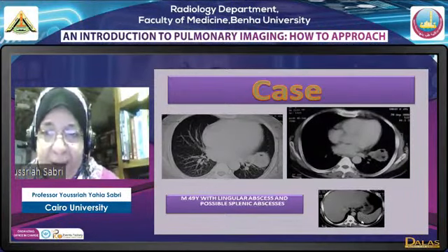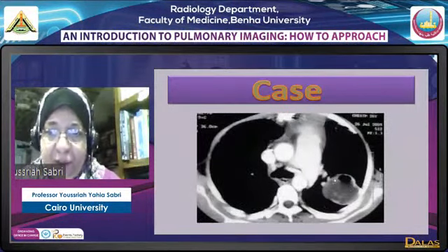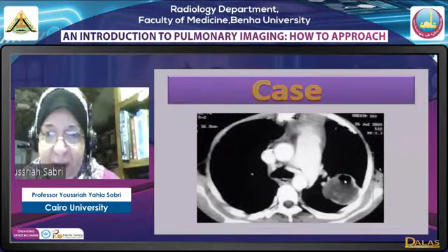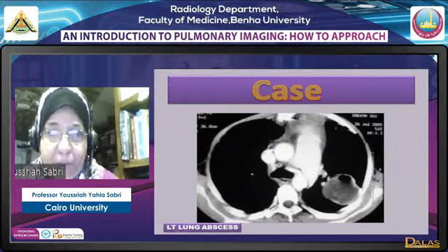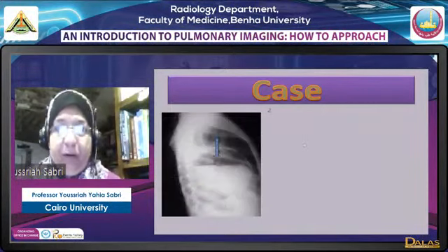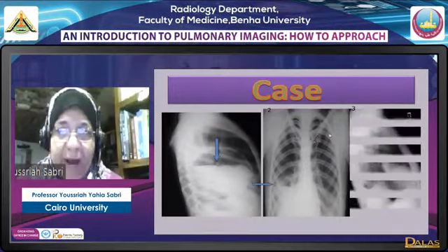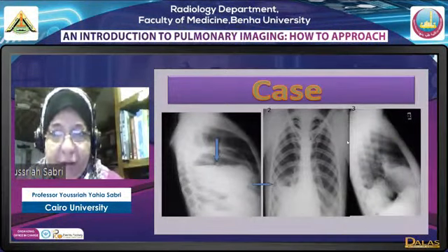There is also another abscess in the spleen here. Another case of an abscess, central lumen with fluid and air fluid level and a uniform wall. Another case. Now here we have 3 different lateral and PA films of 3 different patients. All of them have ruptured hydatid.